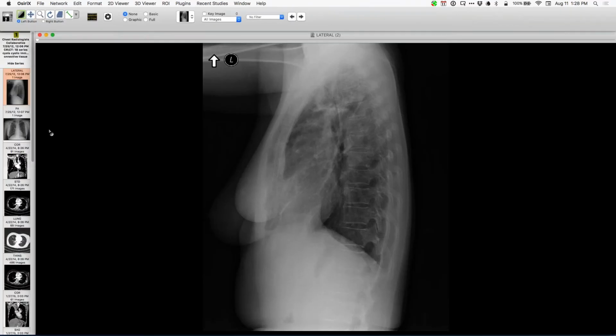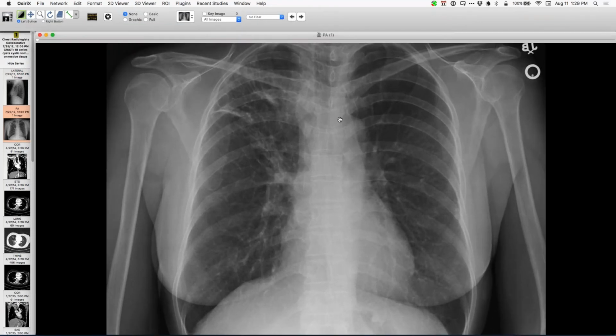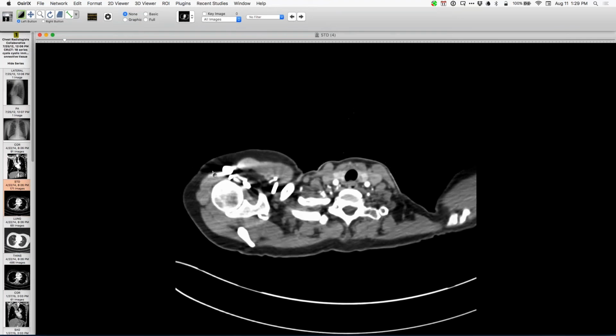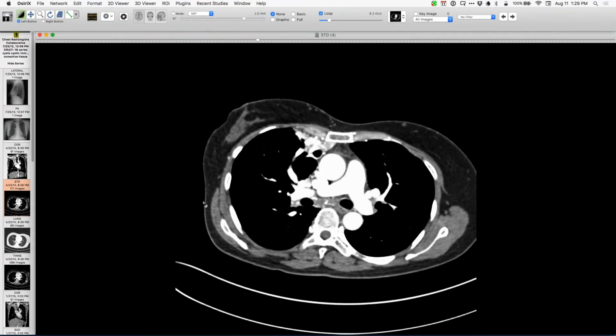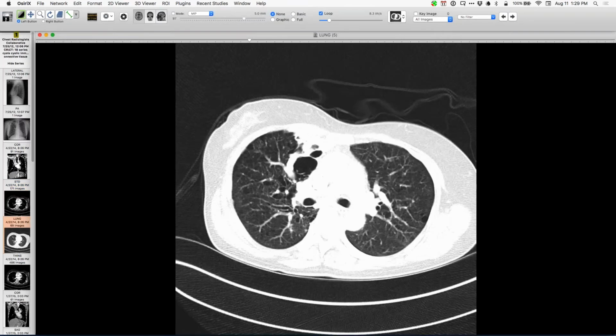This one's a really interesting case. I've shown this one before some years ago from the point of view of findings of tuberculosis. Quite quickly, she has this upper lobe disease, and this upper lobe abnormality on CT is related to remote tuberculosis. And she's got tremendous parasitism of vessels associated with that pathology in the chest. But I'm not showing that today for the tuberculosis, but rather for her lungs. So let me go back in time and show you this, which is from 2014.